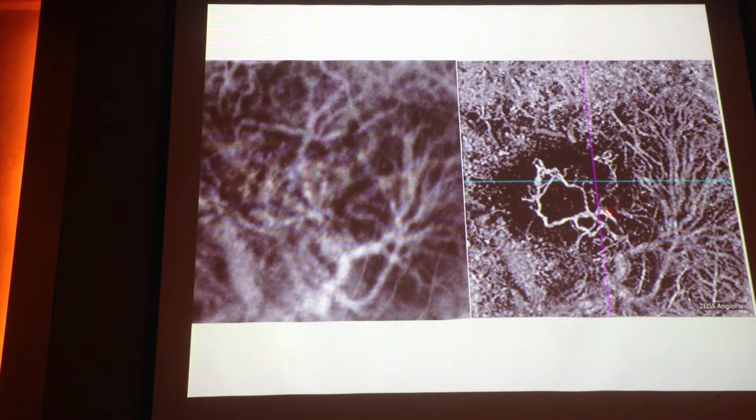And you see here the two different parts, one more mature, I would say, and the other one here. But I don't think it's related to the flow. It's just related to the location.